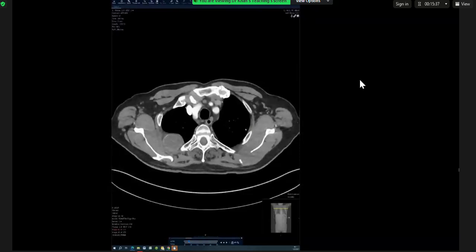The malignancies that can give expansile bone metastasis? Expansile bone mets, yeah. Could it also be thyroid malignancies and potentially breast as well, but I'm not quite sure, to be honest. Okay. So what would you do next?